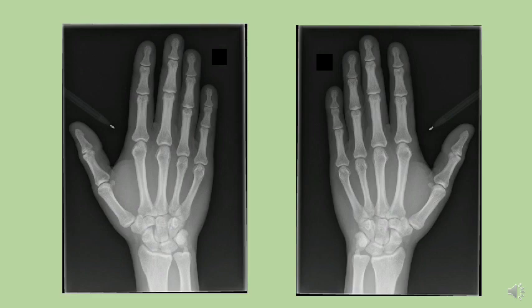It is not possible to say the side of the limb only by looking at the X-ray unless a technician mentions the side on the film. It is always mandatory to mention the side of the limb while taking X-rays. This is how the technician has mentioned it.